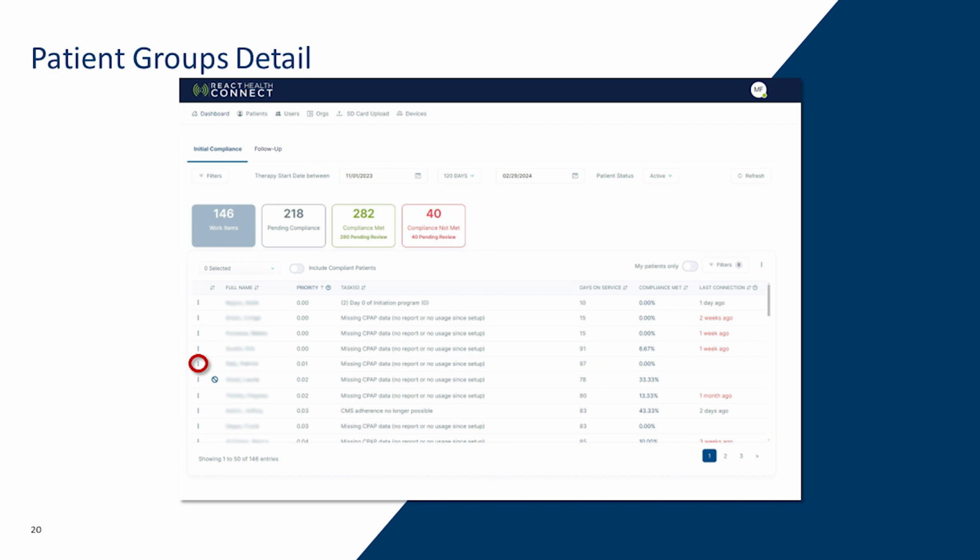Follow-up work items will appear in your follow-up list based off the schedule you select in the follow-up section. Clicking on Follow-up on top of the page will take you into the follow-ups you have entered for your patient tasks. These tasks are managed the same way you manage the work items under your work item list. These follow-ups that are scheduled will only appear under the follow-up list. These may also show under work items in a future release.